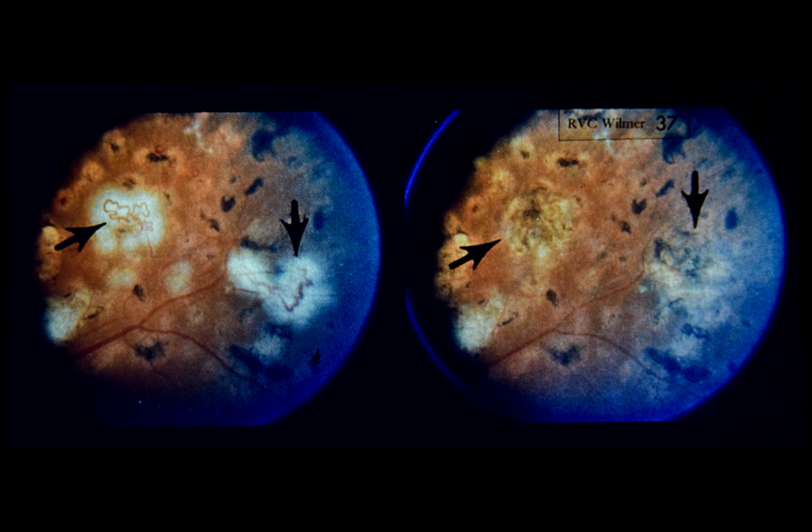In this patient, fragmentation was not achieved at the time of treatment, but 6 weeks later, the vessels were noted to be closed. As in the previous slide, this patient developed retinal neovascularization after initially successful xenon arc photocoagulation. Thus, it is important that careful fundus examination be performed at 4 to 6 month intervals in the patient with proliferative retinopathy.